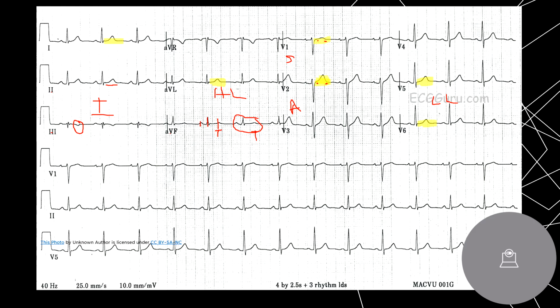It's pretty flat. So all in all, this EKG is pretty non-diagnostic. It's no big deal. The only thing that might be noteworthy is the inverted T's in lead 3. I would probably do a V4R just to look at it. But honestly, it's really no big deal, non-diagnostic. So let's move on. Let's check out another one.